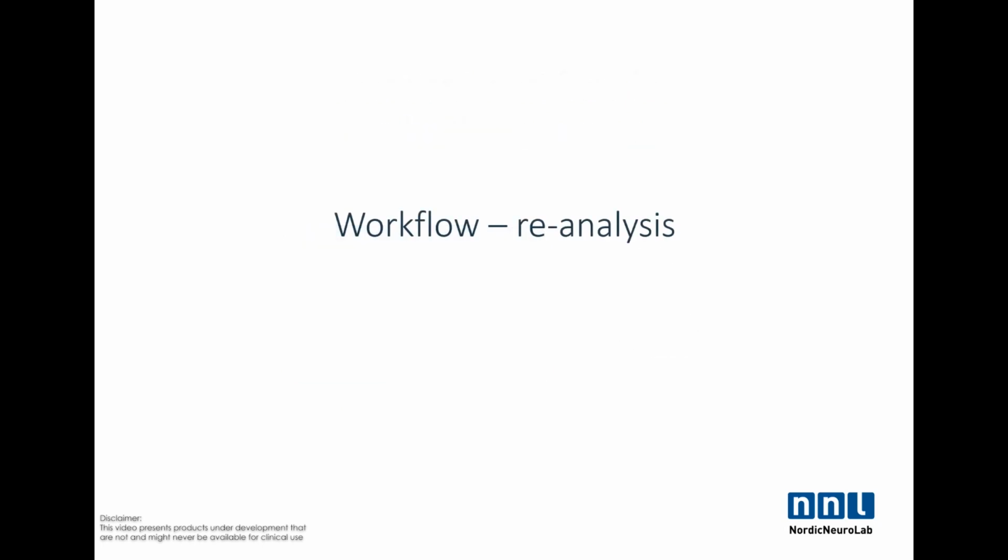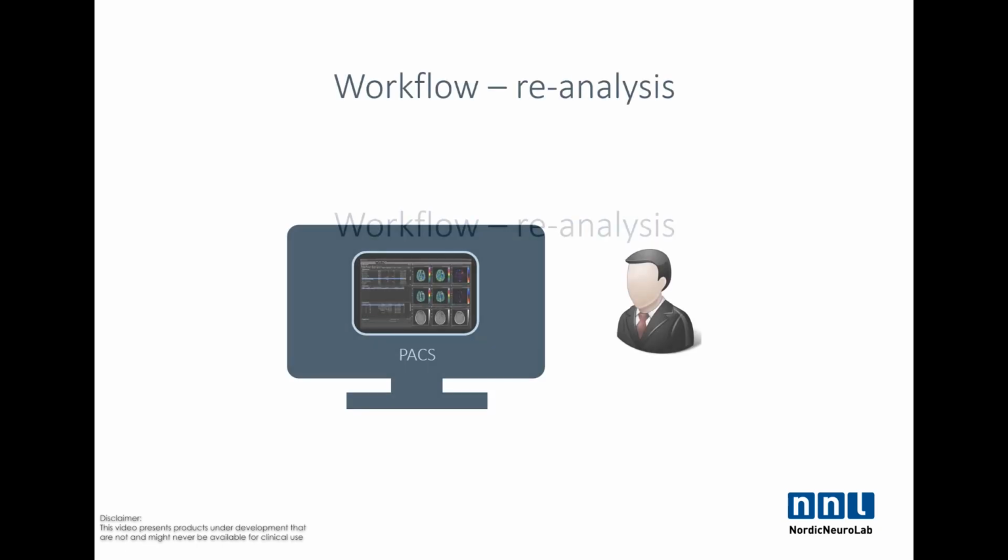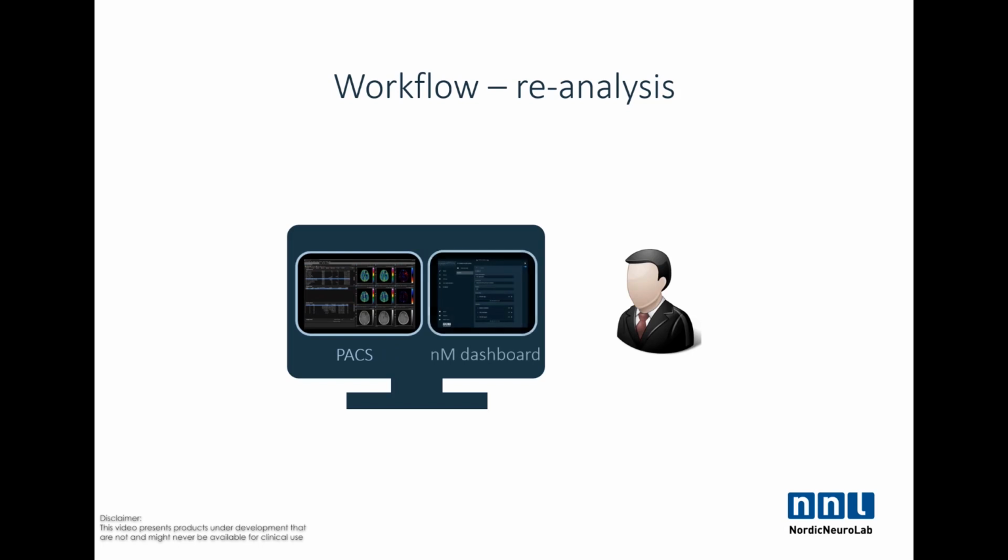However, sometimes there might be a need to reanalyze the current case with different settings. And since the dashboard is web-based, the user that evaluates the perfusion maps can easily access the dashboard from his computer. And from here, it is really easy to change the settings and initiate a reanalysis. And the new results will then be sent to PACS immediately.